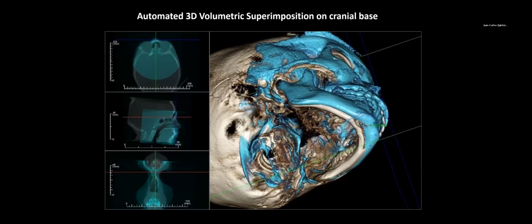The value of superimposition. How do we learn orthodontics? Well, we learn orthodontics from studying data sets and from understanding growth and from understanding before and after treatment results, right? So there's something called superimposition. Now, of course, the value of superimposition is going to be much greater using 3D data than 2D data, right? So this is critical for instance, if you're trying to monitor cessation of skeletal growth on a patient who needs implants, right? So let's say missing lateral incisors, right?